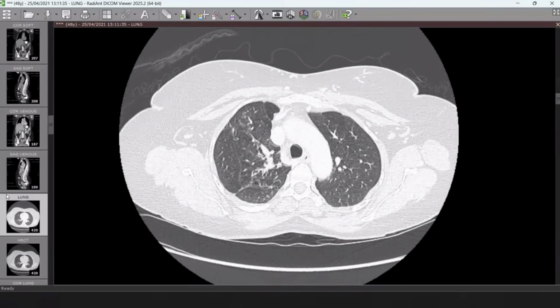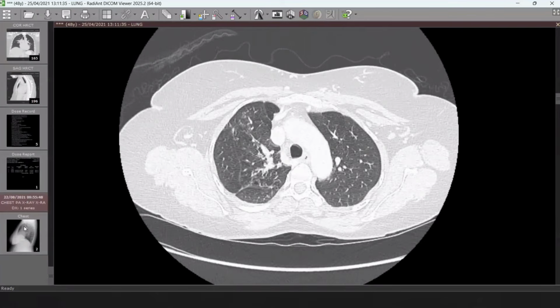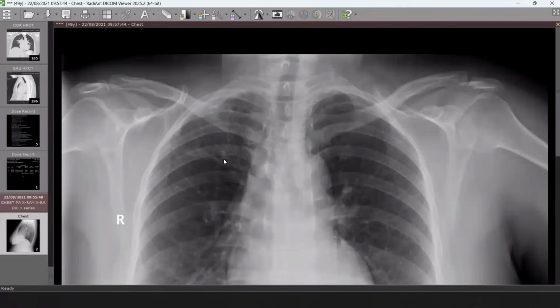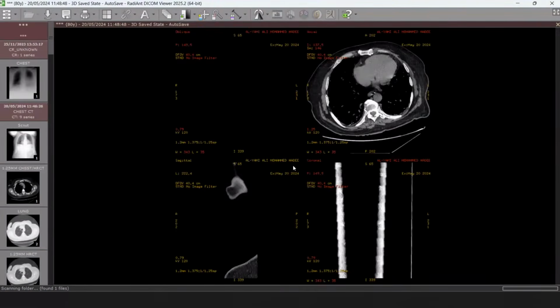So I would like to highlight again how to be familiar with picking up any reticulations and cystic changes in the chest X-ray. Okay. Thank you so much, candidate number 1. Can we go to candidate number 2?